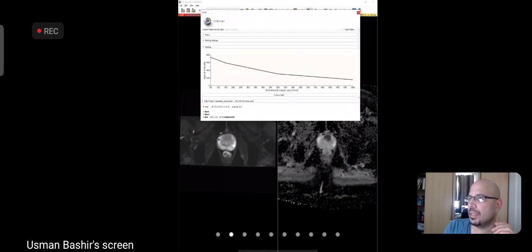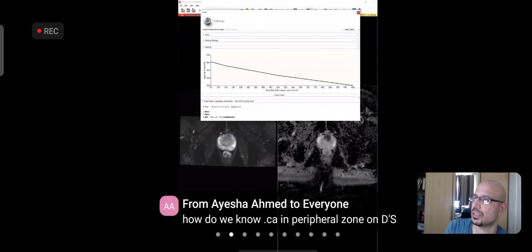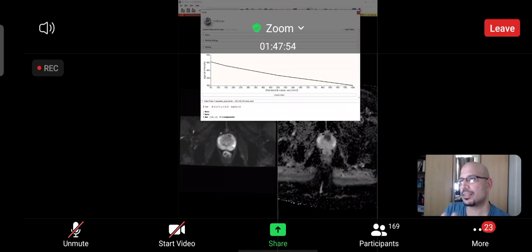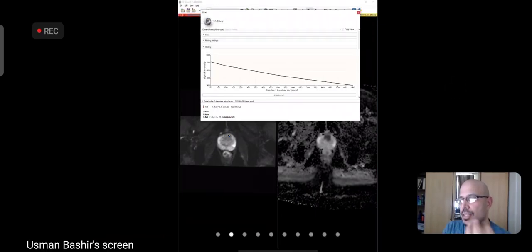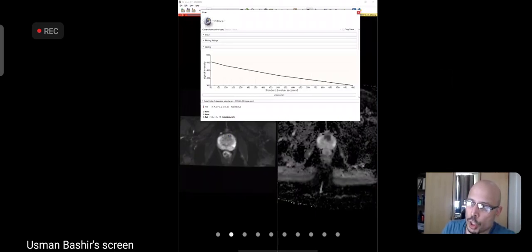Okay, 800 to 200 जा रहा है. So it's got a high value. Slope is shallow, 450 to 300. Right? You have numbers on the y-axis. So essentially, for each pixel, the software calculates the slope for every single pixel. It calculates that, and then it generates that as a visual representation known as the ADC map. That's it. Or इसमें just like last parting message here.